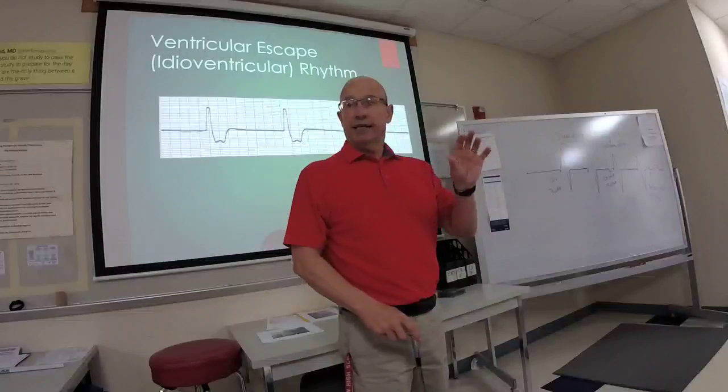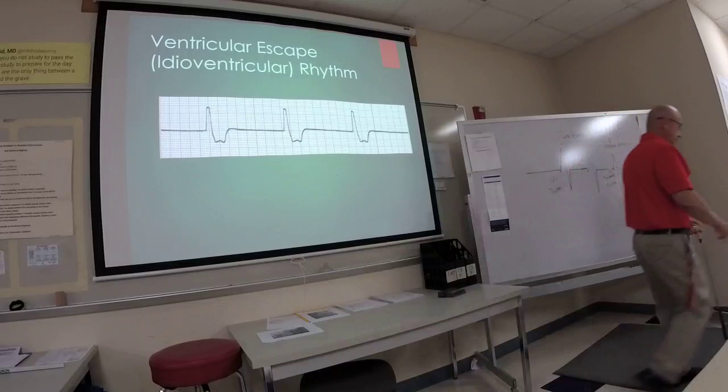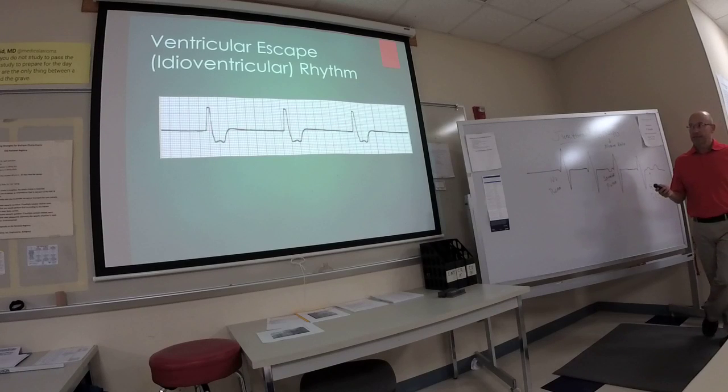These all are going to take some time for you to actually look at and study the interpretations. Just remember these ventricular rhythms are wide. The QRS complexes are going to be wide.